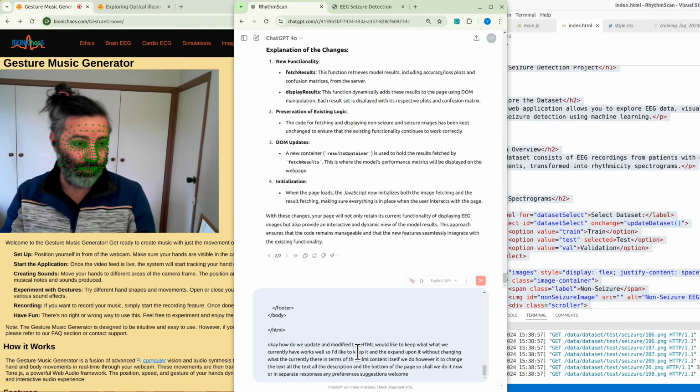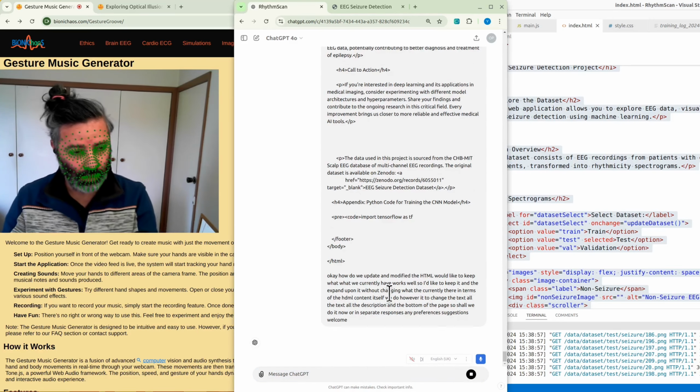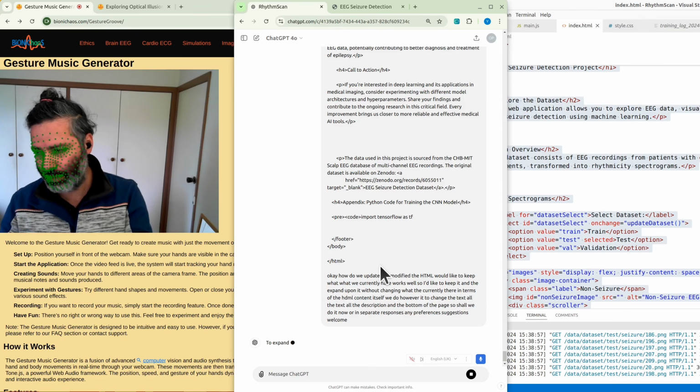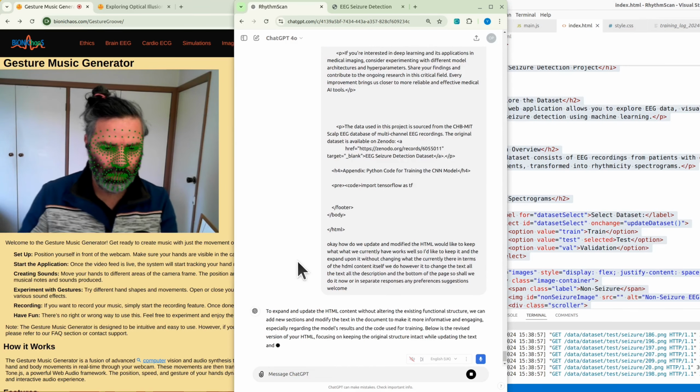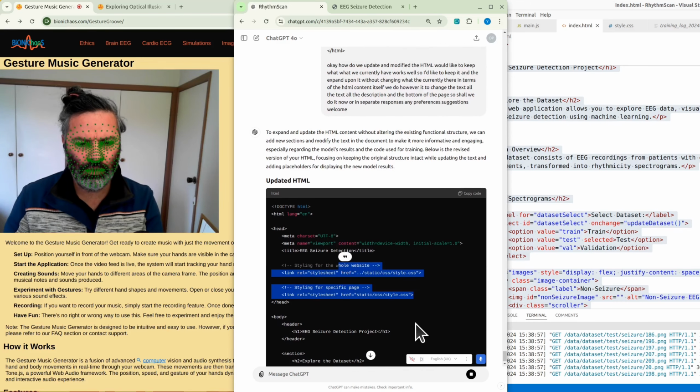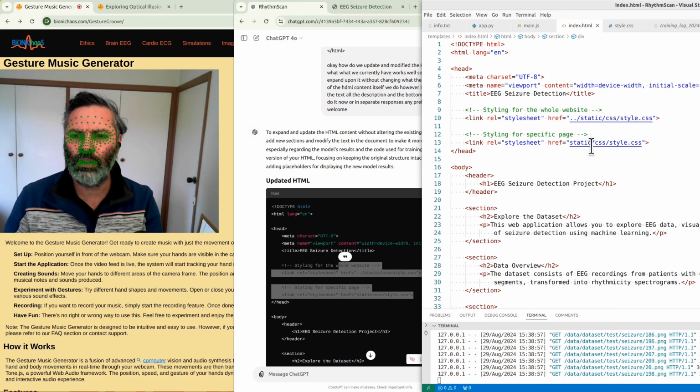I don't know if it will feel like generating the code straight away, or it will just respond in text first. No idea. No one knows. I'm surprised it does anything at all. Styling. Yes, it's generating the code.